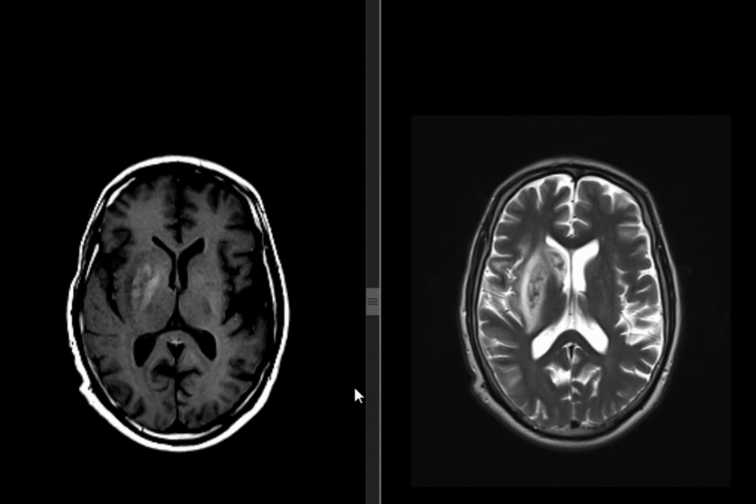Now, what do you have? I have an area at the right side of the basal ganglia. Intra- or extra-axial? Intra-axial, right basal ganglia, mass-like lesion. It appears high in T1, heterogeneous, predominantly high in T2, so it's hyper, or bright. So this is a late subacute intraparenchymal or intra-axial hematoma. Got it?